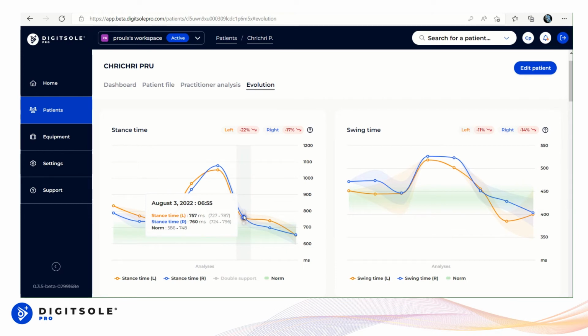So now you get an opportunity to also look at the variability specifically within each one of those analyses, as you're also evaluating the evolution of the time course over the treatments. Or, excuse me, the analysis, which could be related to your treatments if you are in fact treating someone, or if you are just following someone over the course of a life cycle or a season, whatever it is that you're using the analysis for in terms of conducting and collecting data.